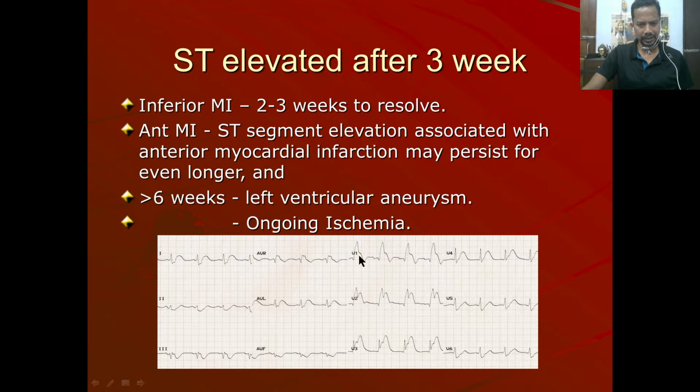So you see this patient had MI and ST is so elevated and 3 weeks have passed by. By this time the ST should have come down, but ST is so elevated. So in such cases you have to think of formation of left ventricular aneurysm, which is a very serious thing. Patient should be referred to a good cardiothoracic surgeon, and maybe that patient might need some Teflon graft over the LV wherever it is about to rupture.